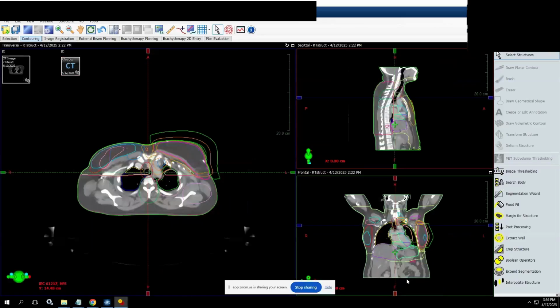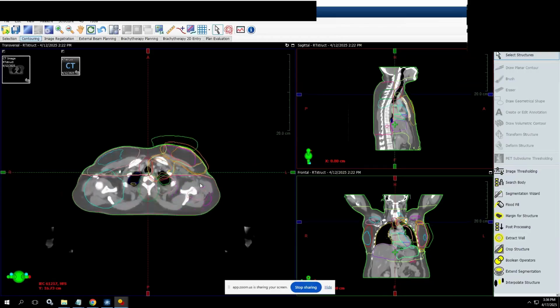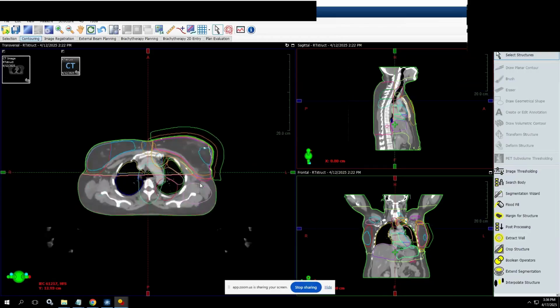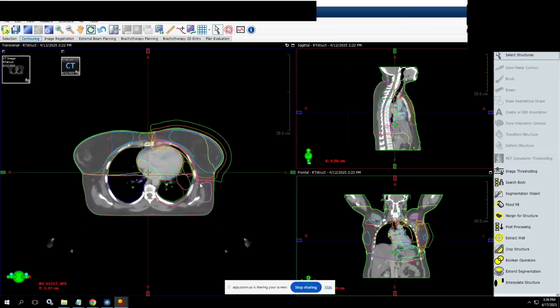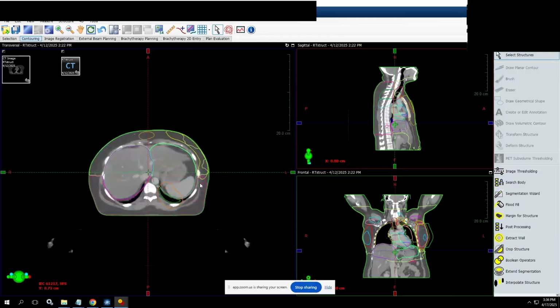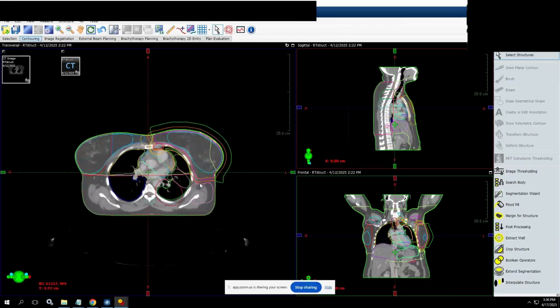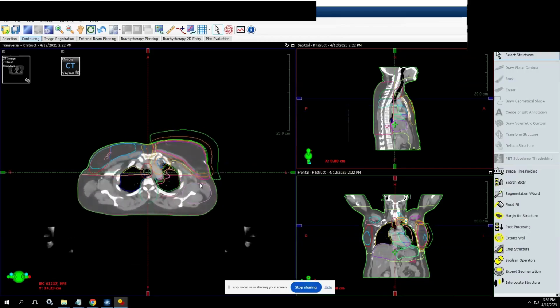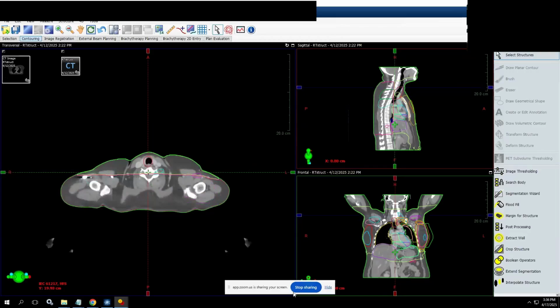One of the last segments that we wanted to demonstrate, and this would be quick, is planning structures. Now, our physics planning structure drawing is often quite complex in order to meet the OAR constraints for breast, and all of these substructures that you are seeing have been drawn by the DRAW system. So, if your physics planning system utilizes a very formalized way of segmentation of structures, we can help with generating a model for generating your substructures.